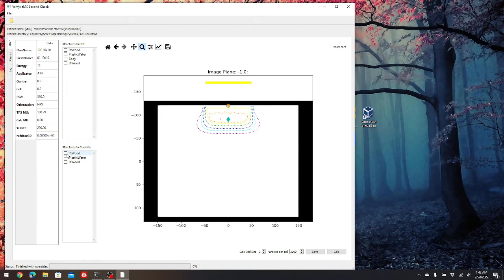This is actually based off of a matrix phantom that I made. So there's wood on either side that holds it all in place. And so you can see if I add these structures, they show up as well. So any kind of bolus that you might have or scar wire, you would have to override those here if you have the density overridden in the treatment planning system.